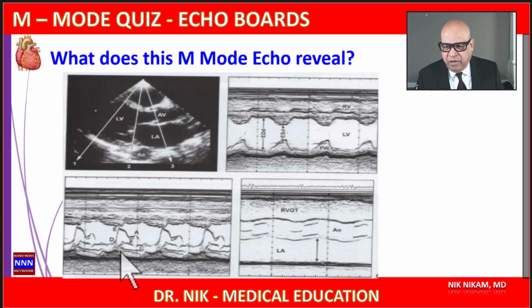And then we have a mirror image of the posterior leaflet. And in the background we see the movement of the posterior wall, and here is the epicardium. And beyond the septum in the front we have the right ventricular cavity, and we are not seeing the right ventricular wall, but in many cases we should be able to see the right ventricular wall if it is visible on the 2D echocardiogram here. So that is a beginning.